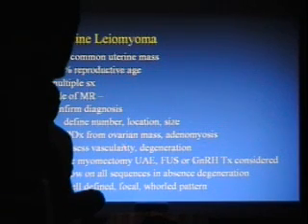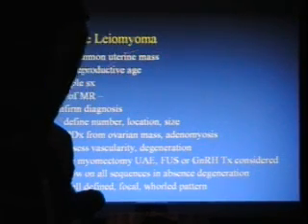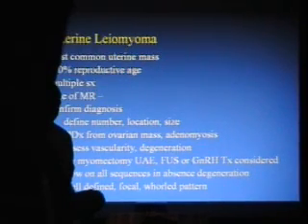Adenomyosis, as I've mentioned. Our role is to assess the vascularity and the presence or absence of any degeneration within the leiomyoma itself. And so as you can see, the whole overall perspective here is changing. We're getting into more detail. You can't just say fibroids, next case. There's a lot to do with MR in fibroids, and we must look at vascularity and degeneration.